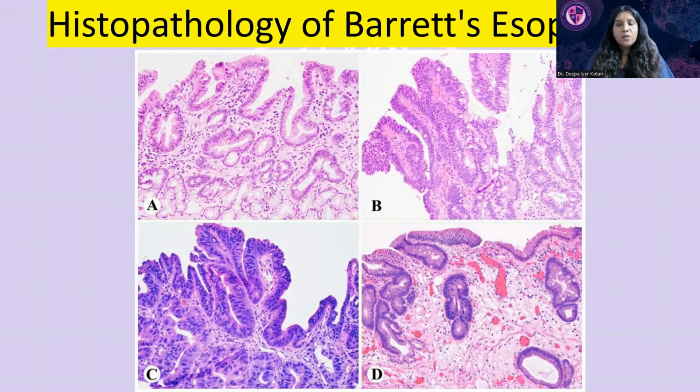All right. So the characteristic cytological finding is enlarged, pleomorphic, hyperchromatic, stratified type of nucleus with increased nuclear cytoplasmic ratio, irregular nuclear contours, and there may be prominent nucleoli also here and there. In this architecture there also is cribriforming in some areas. So basically there is gland crowding also. There may be papillary or villiform architecture here and there. Basement membrane is not breached. That is when you call it a high-grade dysplasia.